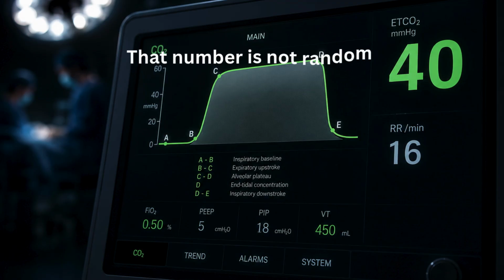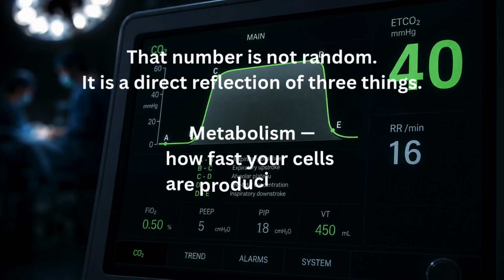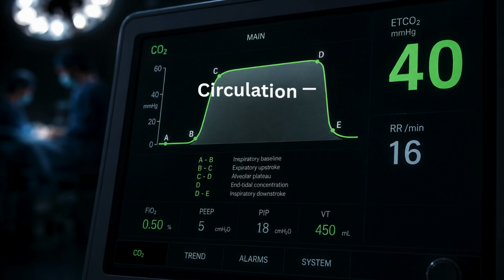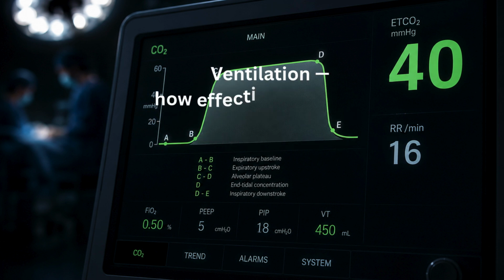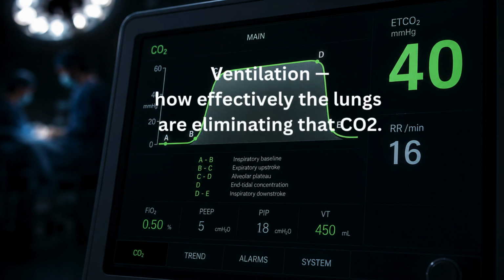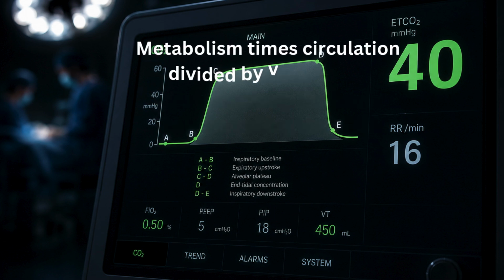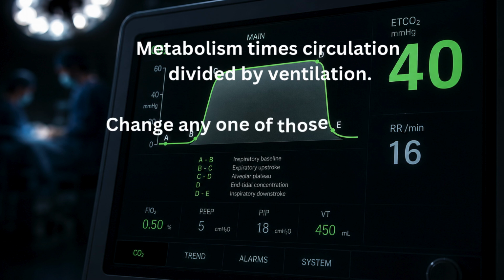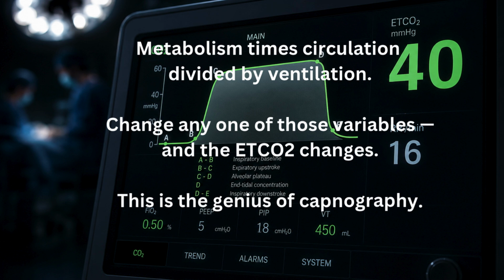That number is not random. It is a direct reflection of three things. Metabolism, how fast your cells are producing CO2. Circulation, how efficiently blood is carrying CO2 from tissues to lungs. Ventilation, how effectively the lungs are eliminating that CO2. Metabolism times circulation divided by ventilation. Change any one of those variables, and the ETCO₂ changes.